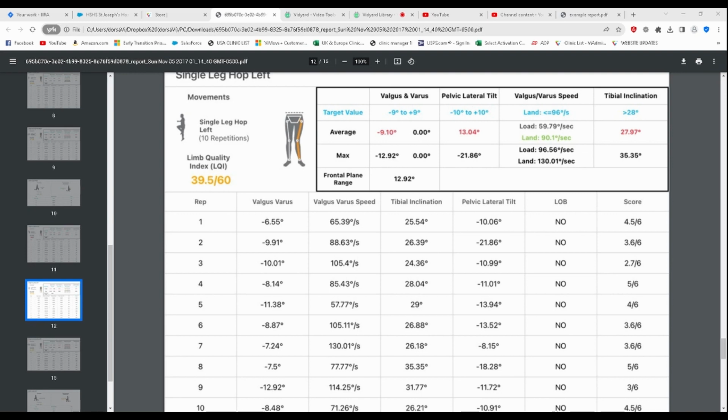They're basically side bending into their QL while they're landing. Even though the subject is only moving on average 9 degrees into valgus, they are still creating a high Q angle and cheating into their hip.